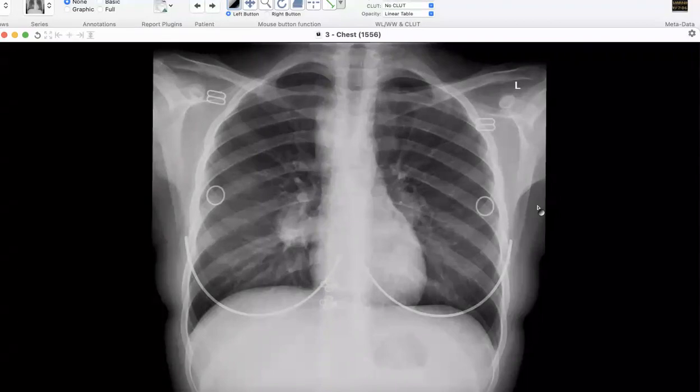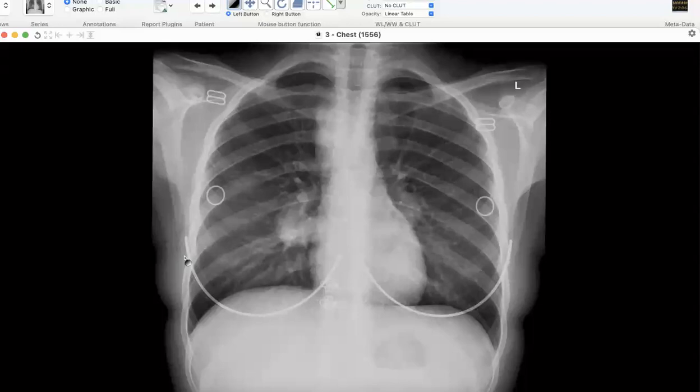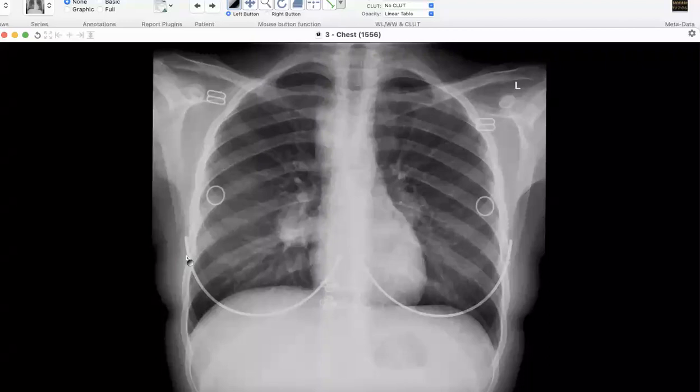So this could be an aberrant artery. Yes, it could be, but generally, what other differentials would you think for a hilar mass? What is the first thing that will come to your mind? Well, a hilar mass, it could be TB. It's like lymph nodes and TB, or not in this age, of course. Malignancy it could be. So you said lymph nodes. Okay. Lymph node, vascular, or any mediastinal lesion.